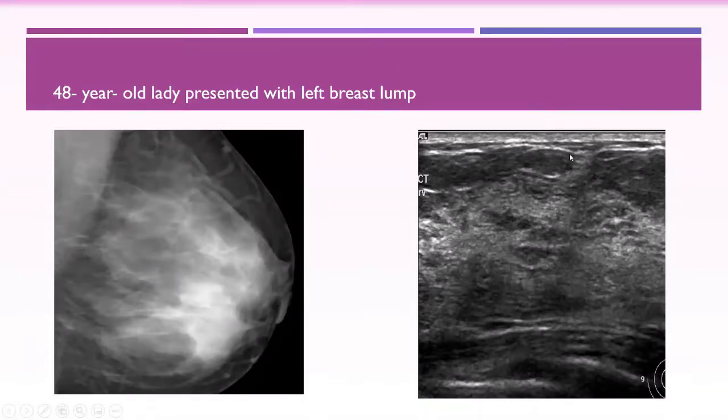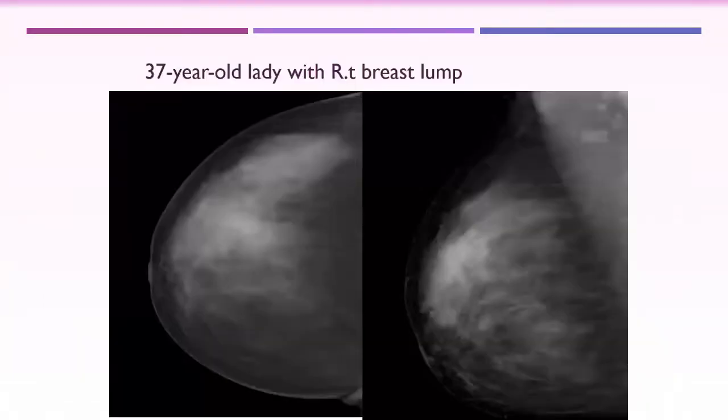What explains the palpable abnormality is this one. And even with the size of this fibrous ridge, you can judge by the size of the palpable abnormality. If the ridge is small, you will find the palpable abnormality just small, like a peanut. If it is large and smooth, you will feel it the same. It will correspond to the clinical abnormality.